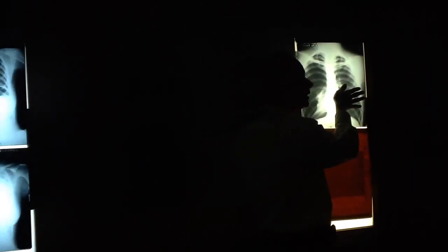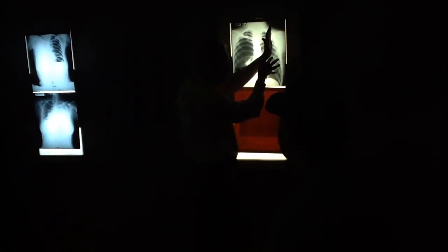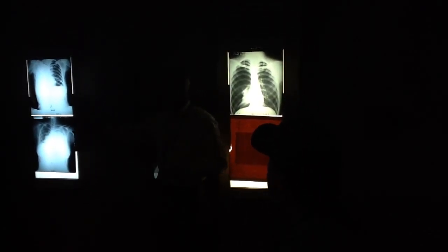If you increase this volume, it's going this way. At this point, yes, the lucency will creep across the midline. It'll start compressing this lung and it'll push the mediastinum this way. It's the same thing here. If we had less fluid, the mediastinum could still be sitting normal. It's just there's more than what that pleural space can hold, and so it's starting to push the mediastinum.